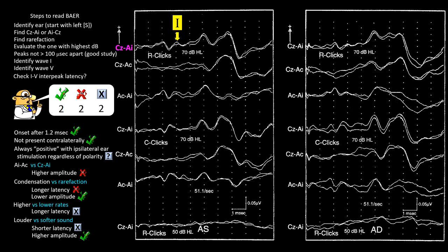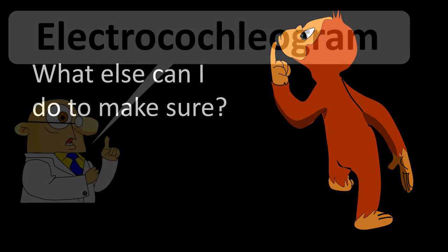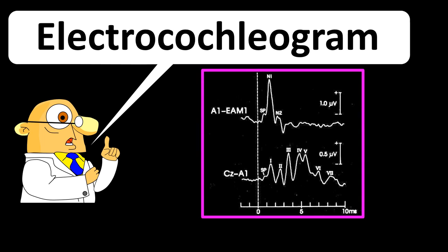So what is next? What else can be done to resolve this issue? And the answer is an electrocochleogram. This electrocochleogram does not belong to this patient.